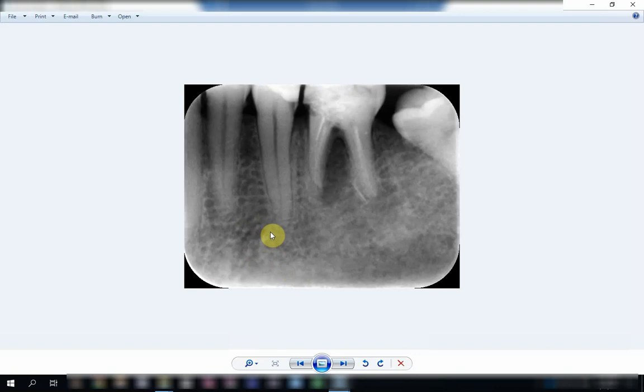What we want to know here is that, generally speaking, this should not be mixed with a radicular radiolucency. If we want to verify whether it is related to the apex of the tooth or not, we have to follow precisely the periodontal ligament space of the tooth to which the mental foramen is close. See, this mental foramen is closer to the apex of, or it's actually located mesial to the apex of this lower premolar, but it's a good example to follow the PDL.